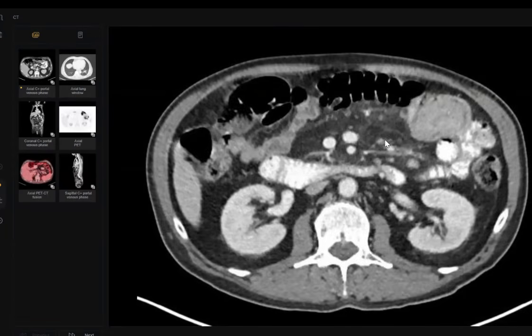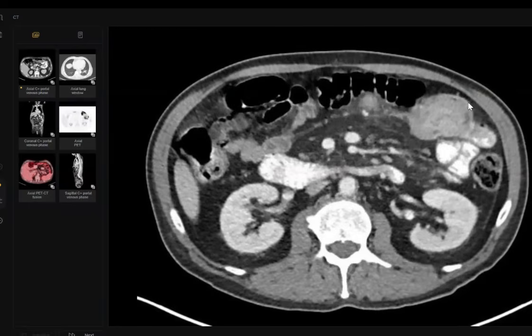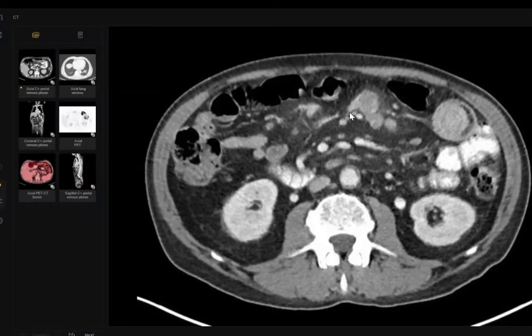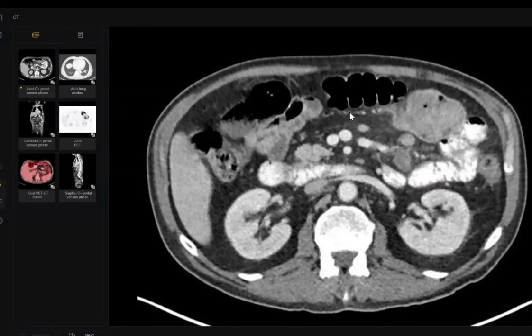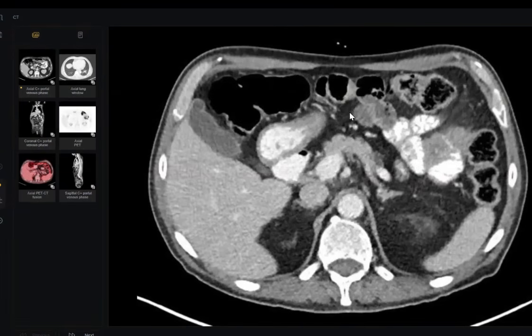We look at all and see this is a target sign. So we must tell there is circumferential long segmental mural thickening with intussusception and multiple mesenteric lymph nodes. Then you told me adenocarcinoma, lymphoma, and tell me about metastasis.